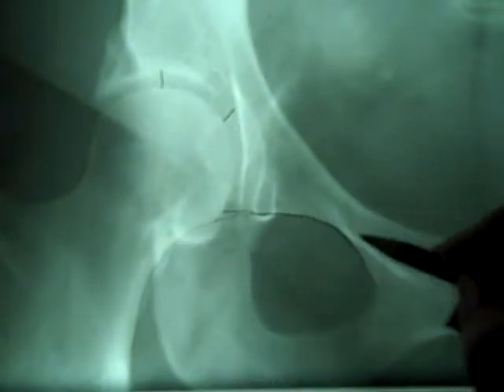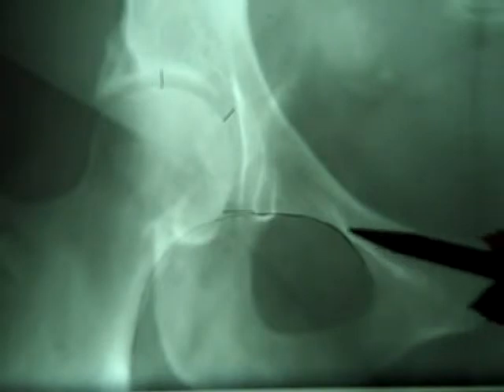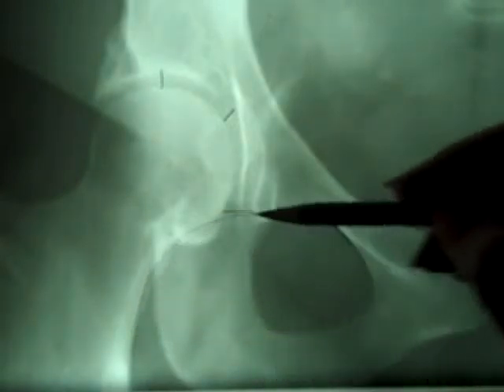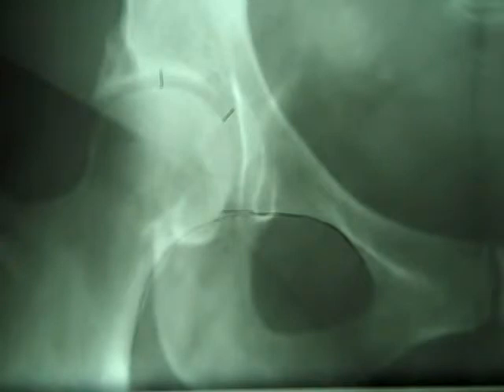So again, the inferior aspect of the femoral neck across to the superior aspect of the obturator foramen. You see how that should form a nice smooth arc across there? A nice smooth arc is considered normal. If you had an irregularity or a dislocation, disassociation, this would not form that arc with the obturator. And so this one is demonstrating normal, and that is what it should look like.